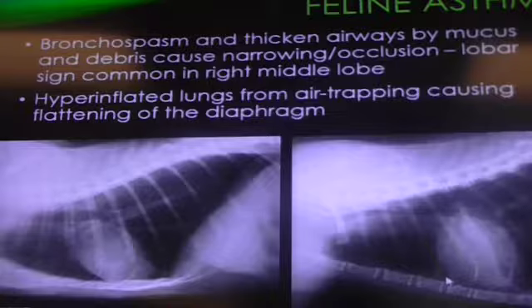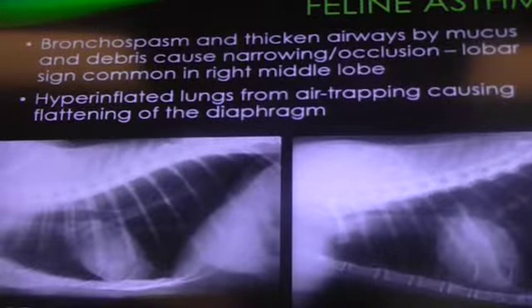But I also heard there will be some collapse, and that's true. So if it's a right lateral recumbency, the right side is on the bottom, on the table, and that side will be collapsed. And the left side will have more air because it's away from the table. So most of it is left, but there is also right side. So if you see something, you can't really tell if it's right or left. So you have to consider, I'm seeing both the lung lobes.